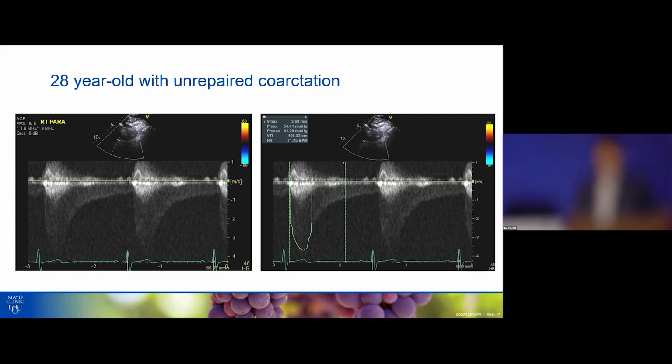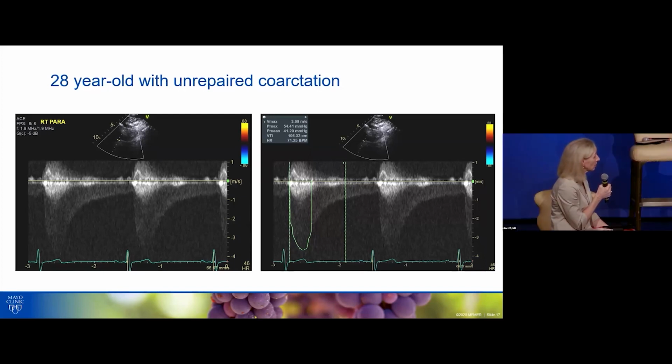And typically we would say that there's significant coarctation if the mean gradient is more than 20. So it's been shown that the mean gradient for coarctation correlates better with the peak-to-peak gradient in the cath lab. So mean gradient correlates better with peak-to-peak measured invasively. And then can you just tell us the T wave that you include there? Yeah, typically the end of the T wave.